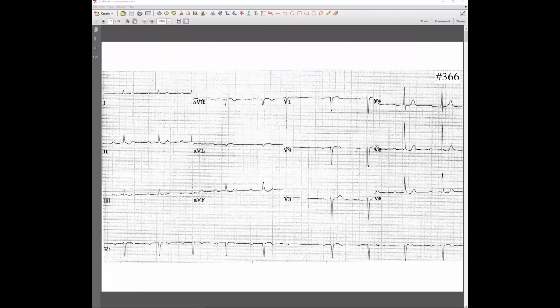Okay, now let's see. I'm going to share this ECG. Can you see it? Yep. All right, there's only one problem: you cannot control it. But if I give you the mouse, you cannot control it, yes? Yes. Okay, so it's up to you. We are listening.